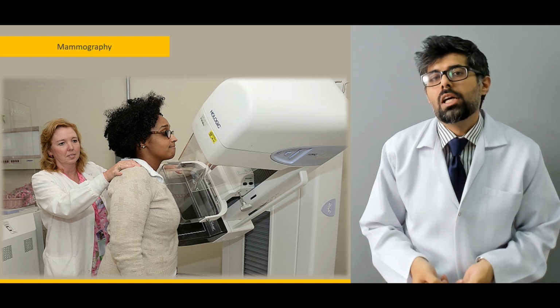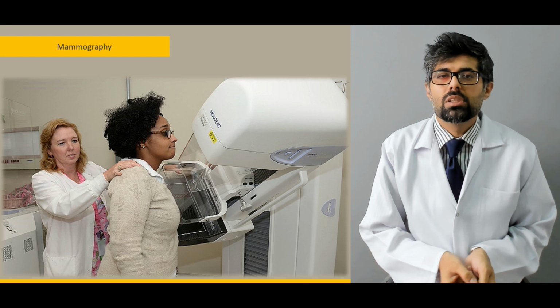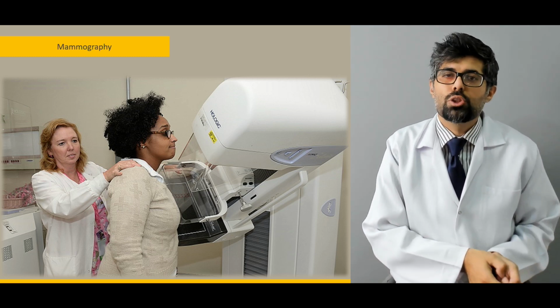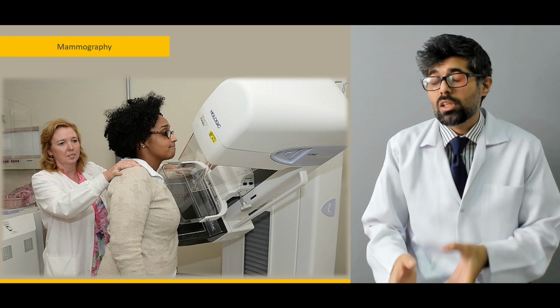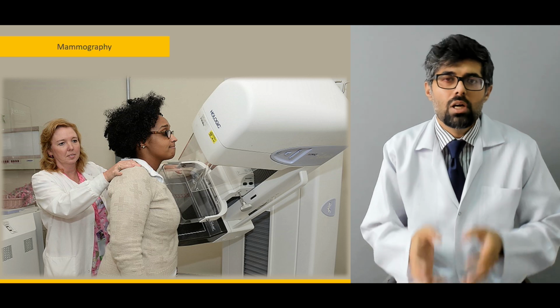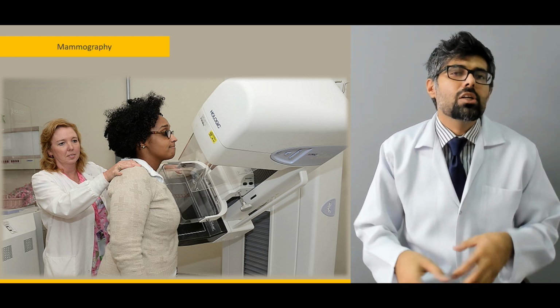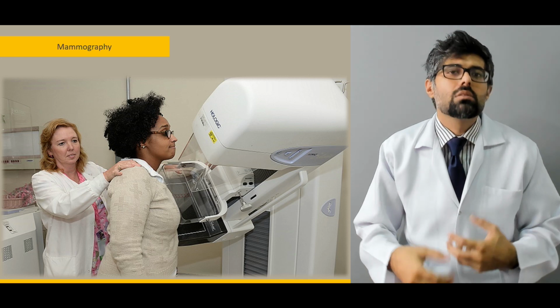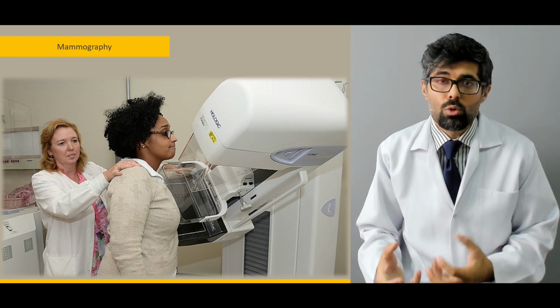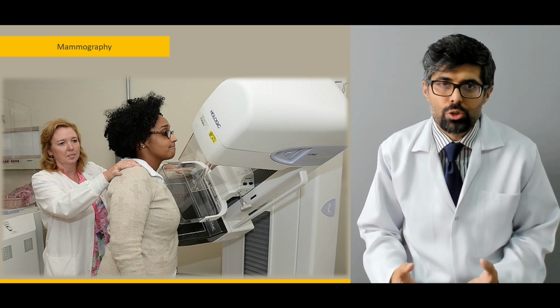One study even claims that even if someone gets yearly mammograms, the chance of getting fatal radiation exposure is 1 in 80,000 years. That's how low the radiation is that a screening mammogram uses. So it's a myth that yearly mammograms cause cancer. No, it is a tool to diagnose, to screen, to find out cancers, to find out tumors.